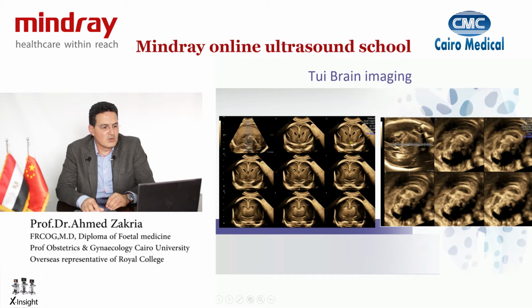So you can see the corpus callosum, the crossing fibers, the lateral ventricles, and even move across that structure from top downwards, so you can see the ventral structures of the corpus callosum or the connecting fibers of the cerebellum at the back, and you can see the midline structures, which is the difficult part that you cannot always appreciate with 2D imaging, and that's one of the advantages that the 3D can offer of getting a closer look at midline structures.